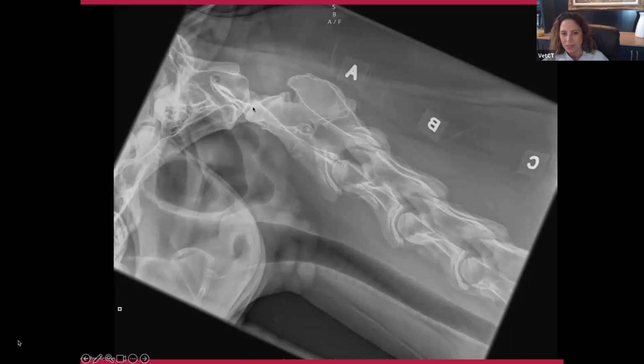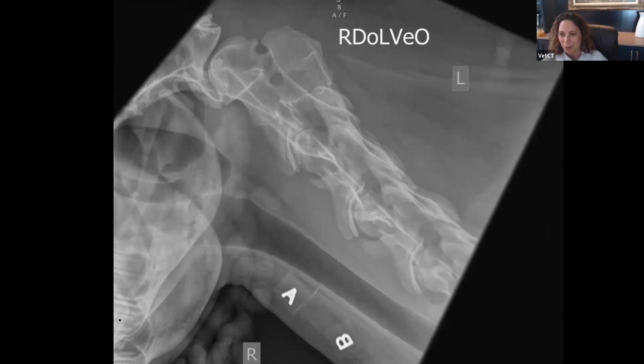The articulation between C1 and C2 is widened, and there's a step deformity there. So we really don't have good articulation. It's subluxed. And if we look really closely on this image, you can see there's no dens, or it's really blunted and rounded. The caudal image of the spine was relatively normal. So all the excitement was in this first image, but I did have a couple of obliques that I wanted to share. On this oblique projection, you can see better the articulation between the cranial aspect of C2 and C1. It's flattened, it's malarticulating, and the dens is sort of blunted or absent.